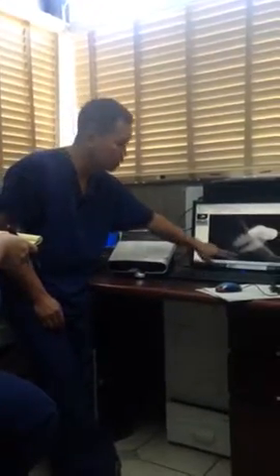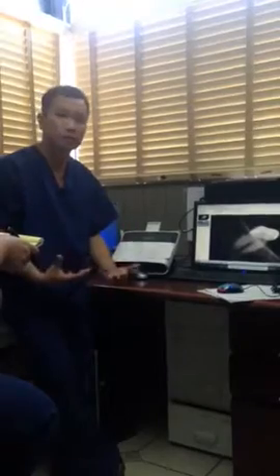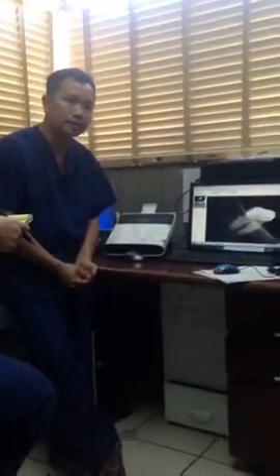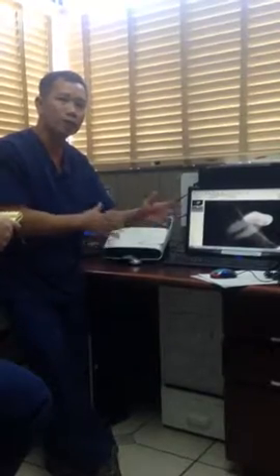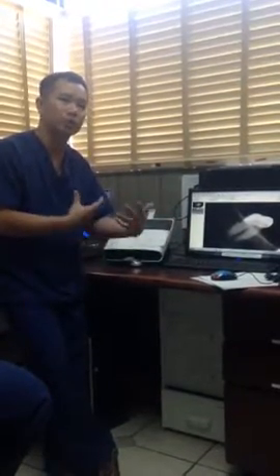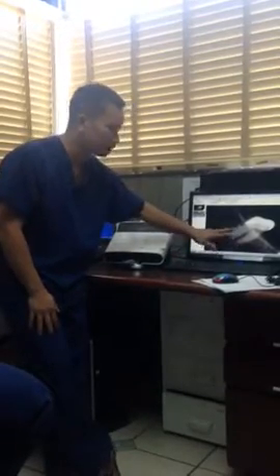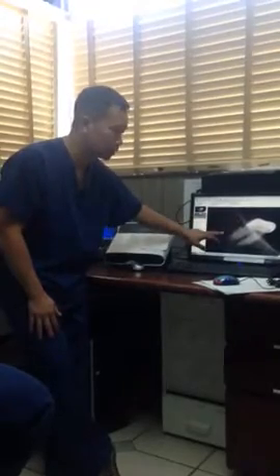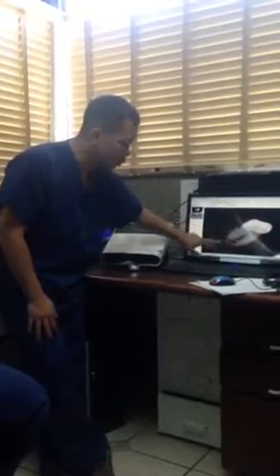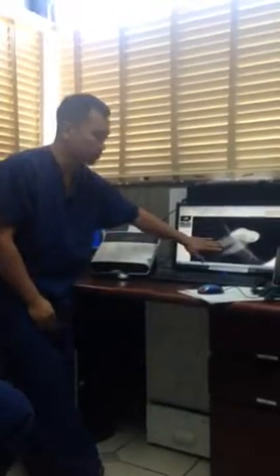So when you see this kind of situation where there's no infection but the patient's giving you those symptoms, that is the cornerstone of why patients come in to get root canals, because something is hurting. Okay? We take an x-ray to confirm that, oh my gosh, you got a bullet in here, or you got a little toothpick in here. We have to confirm what's going on down here. So we combine the patient's symptoms with the x-rays.